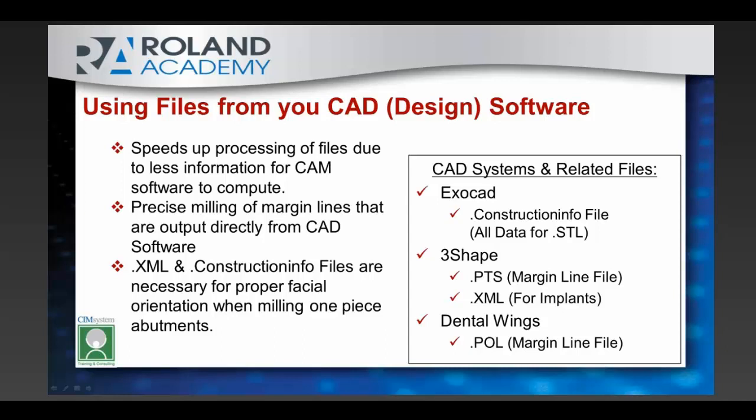A lot of these files you can get as part of the output options in your manufacturing output. And if you're not sure how to access those, definitely contact the reseller of your CAD software, and they should be able to tell you how to output these additional files.